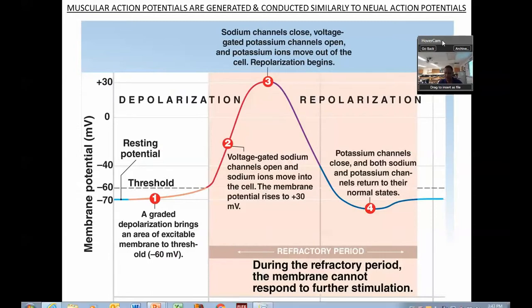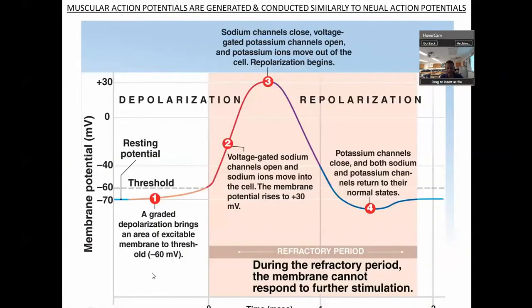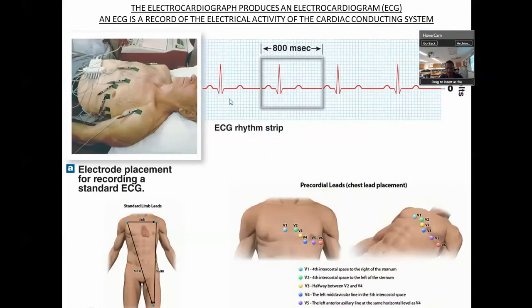This is just some other things. So what I'm actually going to do is combine this video with the actual live demonstration. But I wanted to go over some of the things that we utilize in class. For example, the different probes. And here's your ECG, the rhythm. And so you can see here's your P, QRS, and that would be the T. You can see the different attachment points.